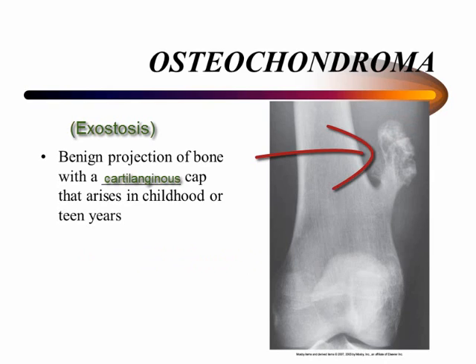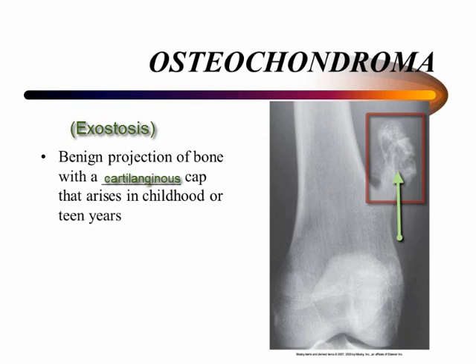The exostosis occurs in the epiphyseal plate and grows laterally from the epiphysis. A true osteochondroma must exhibit the cortex and medullary portion as continuous bone growth. A radiograph is the preferred method to demonstrate that the cortex of an osteochondroma blends with that of normal bone. The long axis of the tumor characteristically runs parallel to the parent bone and points away from the nearest joint.